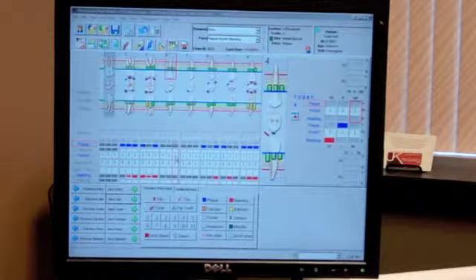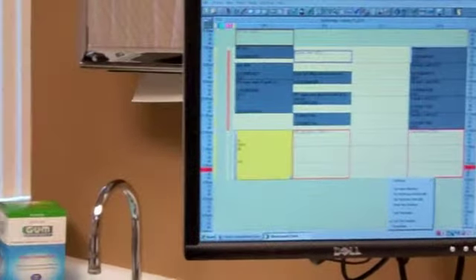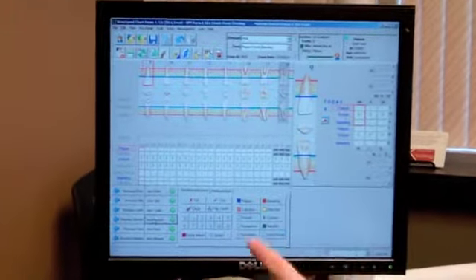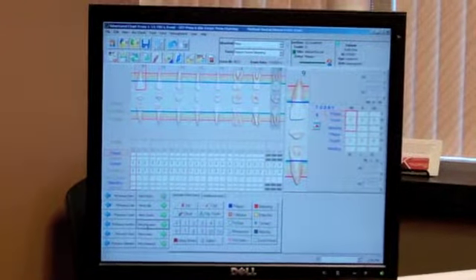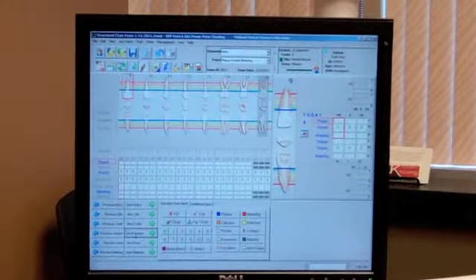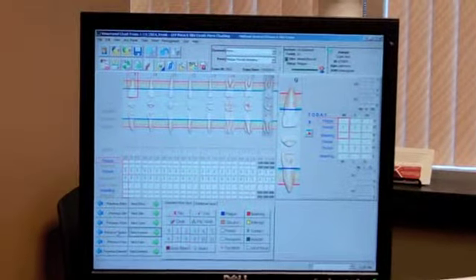Sometimes it goes on our other screen, and it has numbers like a calculator, and I could click on 4, and then that should change it there. You can also go here to next section. That would be the next quadrant. Next pass would change things up there. I don't usually use that. It's more the next site, next tooth, next section. Previous section would bring you back.